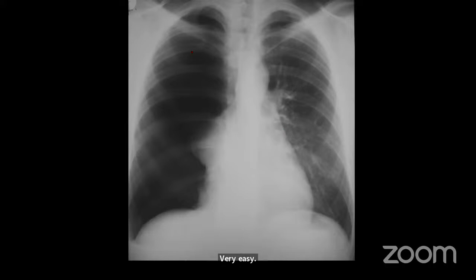So this is a pneumothorax on the right side. In a pneumothorax, you will see the part of the lung which is occupied by air to be totally black. The pneumothorax can be big, it can be very small. This can be the lung and this can be the air, totally black. Okay.